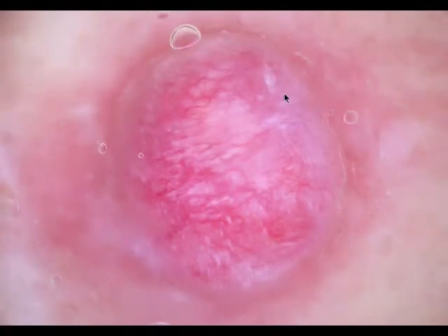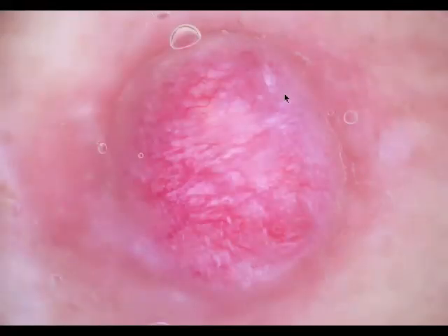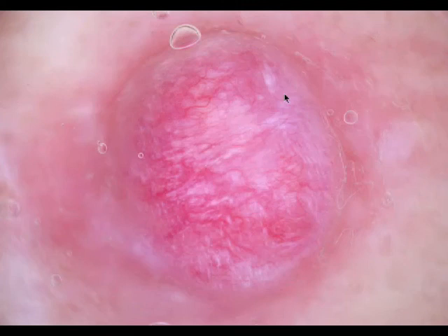So what's your diagnosis? Again, basal cell carcinoma, but take care, because not every lesion with serpentine branched vessels is a basal cell carcinoma. This is a malignant peripheral nerve sheath tumor. And whenever you have a nodular lesion where the vessels are arranged in a non-specific pattern, or where the vessels are arranged in a way that they are branching, then you have to excise it.